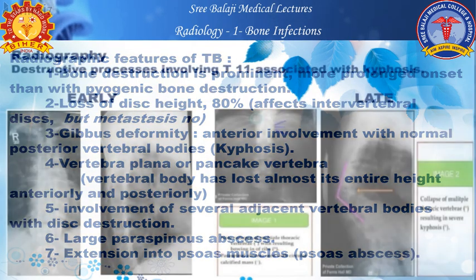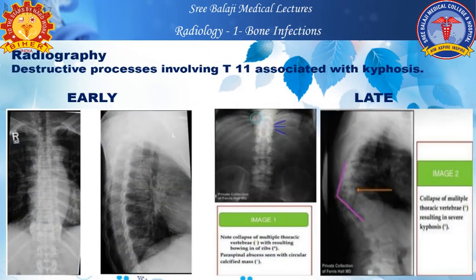Now, some of the demonstrations with X-rays of the spinal lesions. The first X-ray shows a lesion in D11 vertebra, which is seen as a reduction in the vertebral height in AP projection. Lateral view shows the increased density of the vertebra with the adjacent discal reduction, which is typical of tuberculosis. As the lesion appears progressive, the late feature will be a gibbous formation, which is seen in this picture.